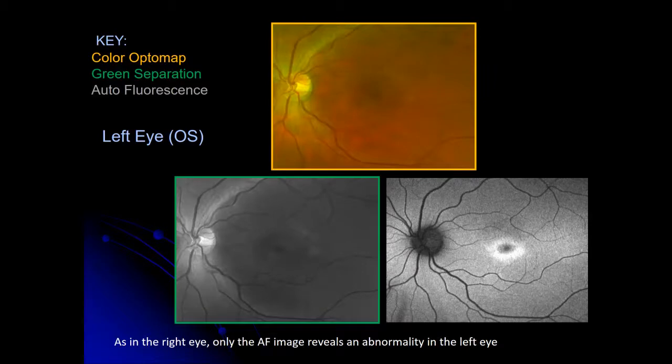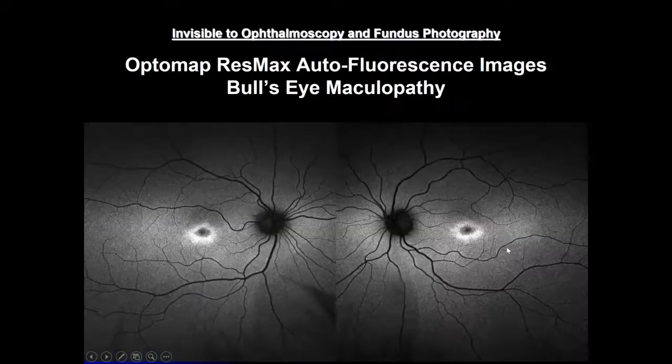Here's the left eye, same kind of comparison. The finding that's most significant is here the autofluorescence, showing us that we have some active tissue. So the retinal pigment epithelium is sick right around the fovea. Right in the fovea is still a zone that's still pretty normal, and it's good acuities. Here's what it can look like bilaterally.